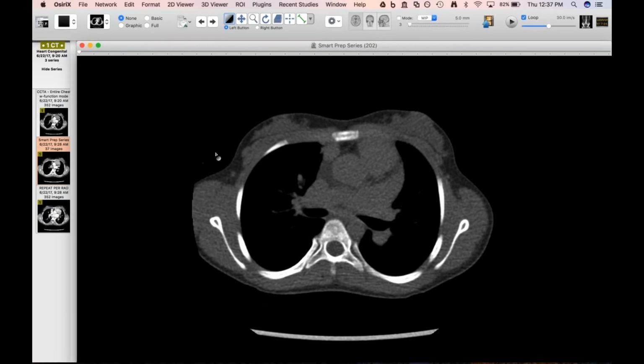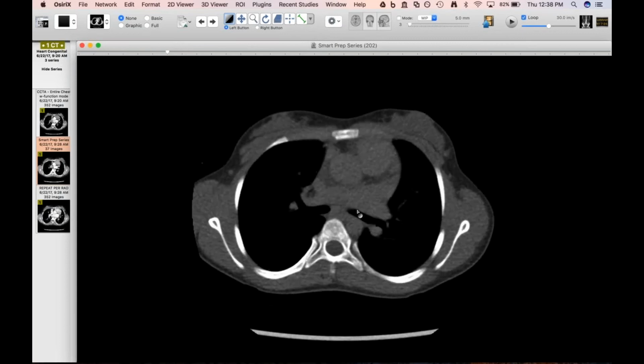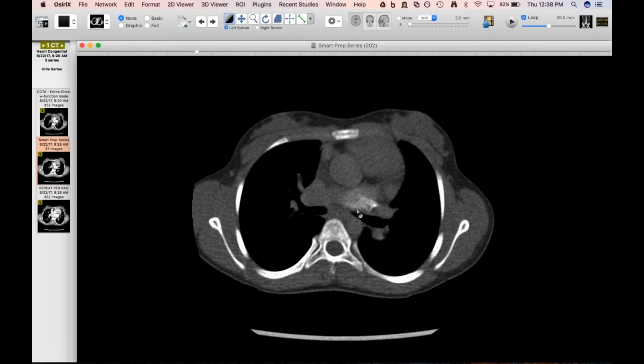And so the question was, does she have Eisenmenger physiology and pulmonary arterial hypertension from the shunt that was corrected, or does she have a shunt? You know, or did they fix the VSD, or is there something else going on? And I'm going to show you just the timing bolus here, because we fortuitously injected in a location where we will see that the first place that gets contrast is here in the left atrium.